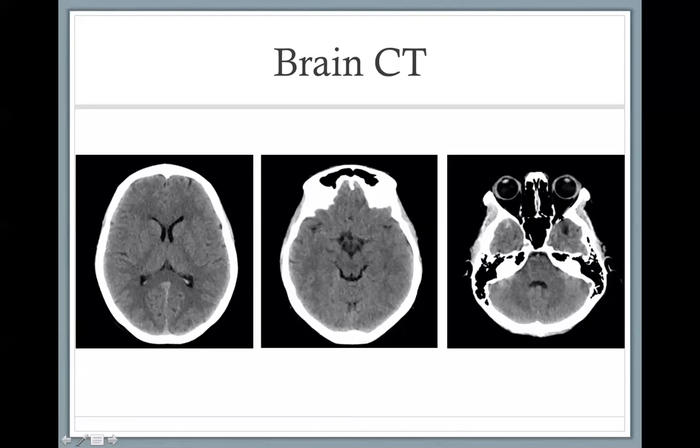They're very dark, so the attenuation values of fat here are not very well differentiated, and neither are those of air, because it fills the paranasal cavities and the temporal bone. At the same time, we don't see the bone architecture very well. So this is not a bone window. It's not a lung window. This is a regular soft tissue window.